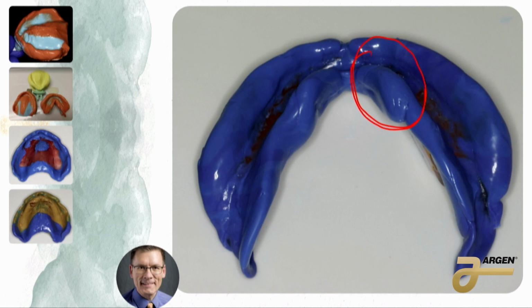That area has to be sealed off. So if you are receiving impressions that have this and your dentist is taking a good impression, you cannot cut off that data. That is extremely important data. Also, a full retromolar pad. I know we don't always get those, but when you do, you do not want to sacrifice any of that valuable data. These impressions take a long time to do, so we want to save and preserve as much as we can.